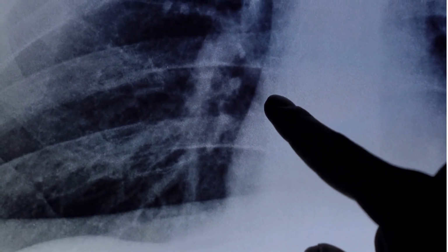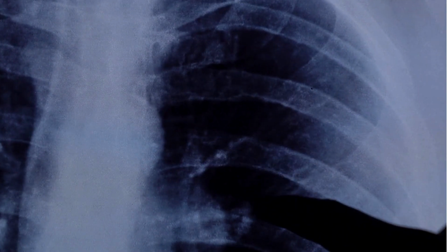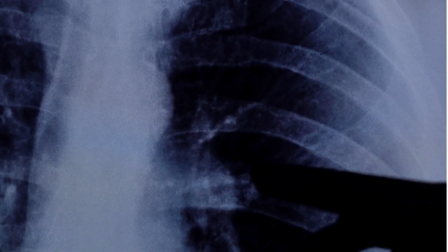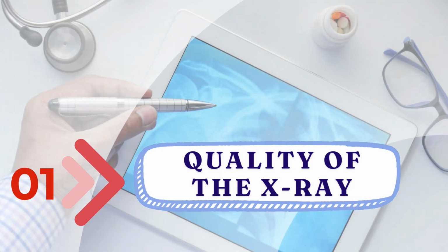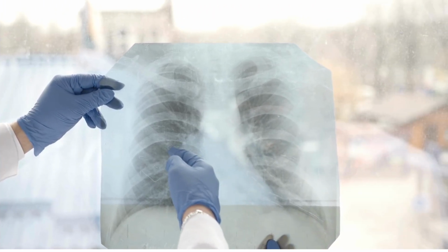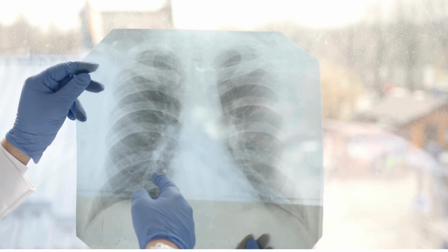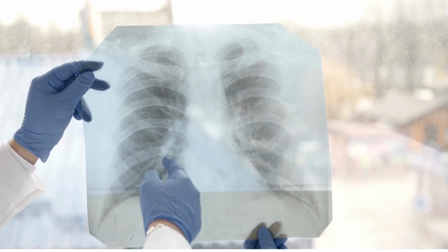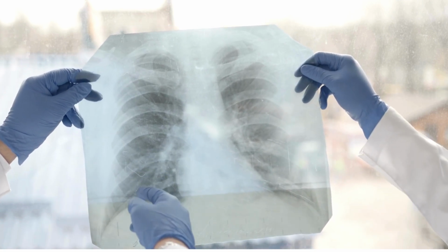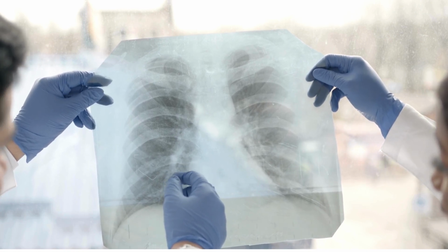Now let's break it down into actionable steps you can use to interpret any chest x-ray. Step 1. Quality of the x-ray. Ensure clarity. The first step in interpreting a chest x-ray is to assess the quality of the image. Is the image clear and well exposed? A poor quality x-ray can make it difficult to spot important findings, so always check the following.